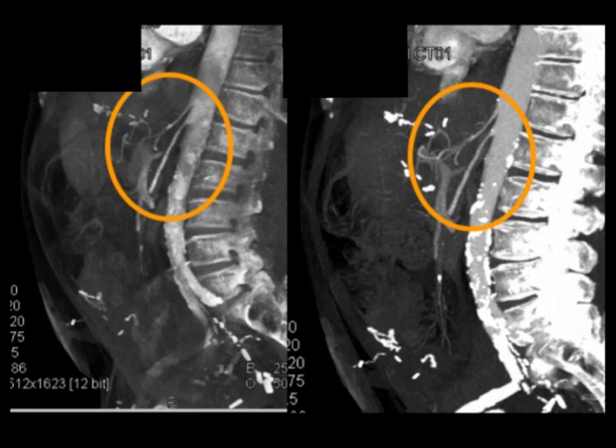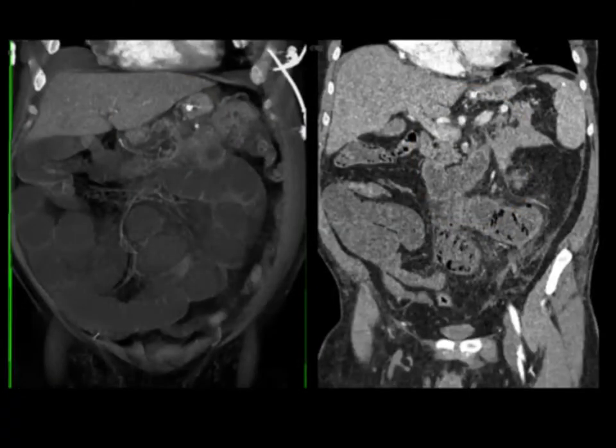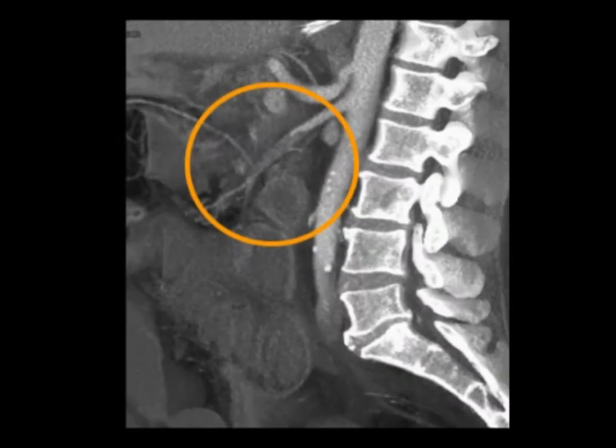An example, patient, rule out ischemic bowel. The bowel here looks dilated. It looks a bit dusty. It doesn't seem to be enhancing very well, and perhaps there's pneumatosis. When you look at the sagittal view, this was originally read as negative on the vessels. What you see in this patient, there's minimal plaque in the aorta that's calcified, but look at the celiac, it looks perfect, and look at the SMA proximally for several centimeters. It looks perfect as well.